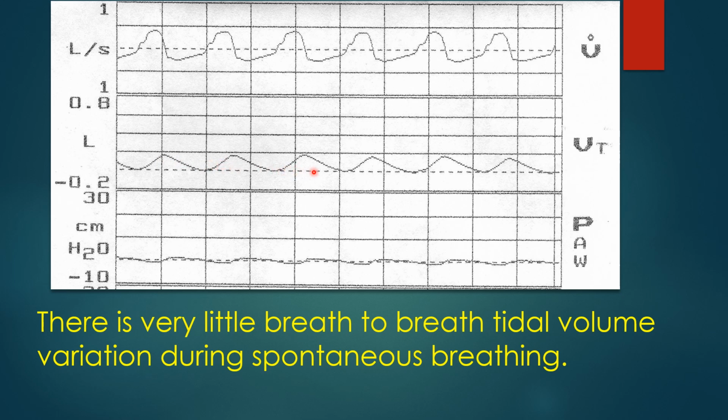When you and I are breathing comfortably, not intubated, not sick, not in the hospital, our tidal volume varies pretty significantly from breath to breath. It can be 40% variation and be very normal breathing. So when you see no pause after exhalation and a tidal volume that is almost the same every breath, that is not a good sign.